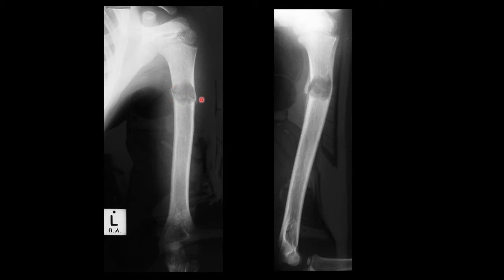C for contents. This is a lytic lesion. You can see the normal bony architecture is destroyed and replaced with something that is more like air or soft tissue. You can see here, this is an axilla, this is air, and this is the skin and soft tissue and muscle over here, and that's bone. So you can see that this density is somewhere around soft tissue or maybe air with residual bone blocking it.